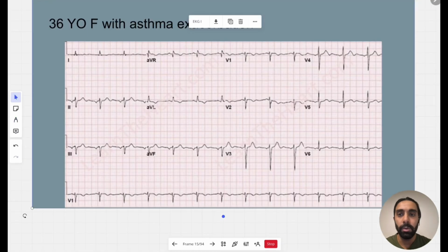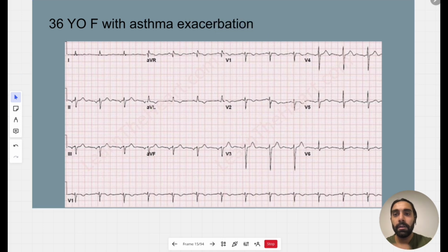Alright, you know what to do. Pause the video. This patient is a 36-year-old female with asthma exacerbation. Go ahead and review it. So there are 13 blips, so that makes it normal.